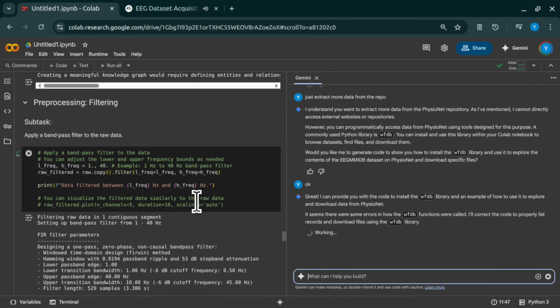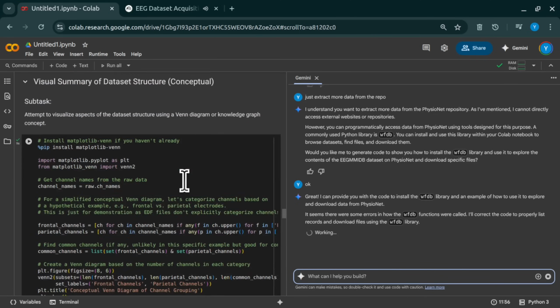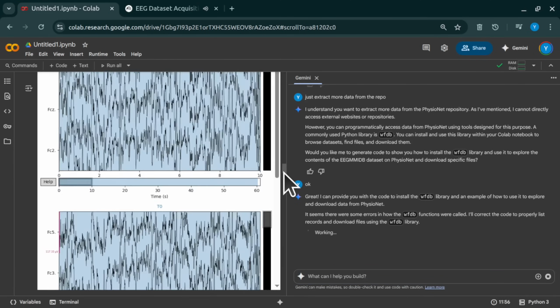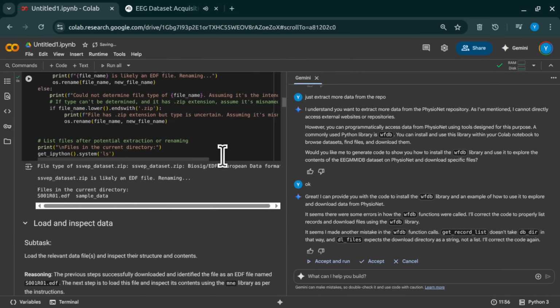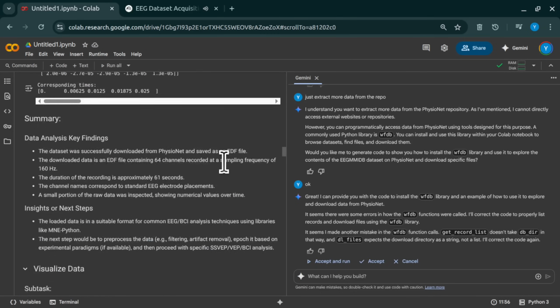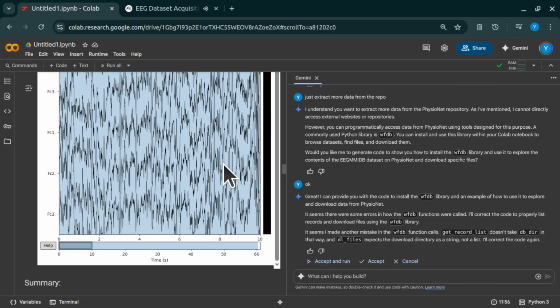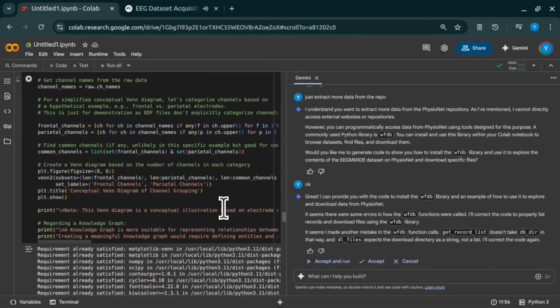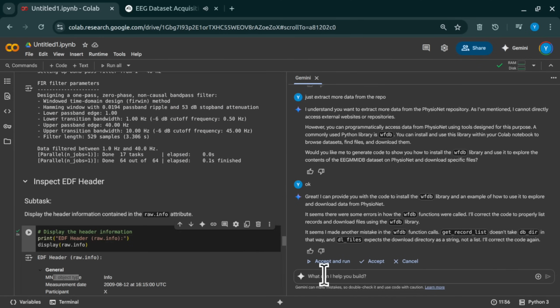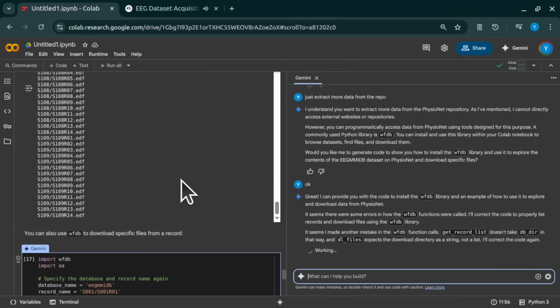Like, where do you even find this data? Right. How do you download it successfully? Then how do you prep it? And maybe the most exciting part, how do you actually look inside and understand what you've got? Think of this as your shortcut, your express lane maybe, to getting genuinely well-informed about how BCI research actually starts. We're aiming to turn these potentially dense technical steps into something more insightful, maybe even uncovering a few surprises along the way. Okay, so let's talk about that quest for data.